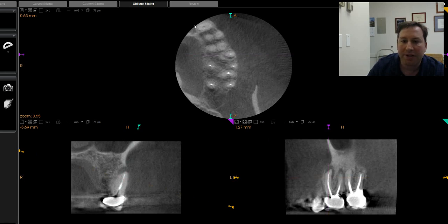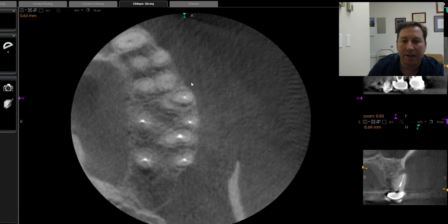And here we can actually see, I'm just going to focus in on the axial section. When we look at this tooth, this mesiobuccal root, we can see it's an oval shape, and we see here that the root canal fill is deviated slightly from the center. The law of centrality dictates that any nerve and blood vessel that is responsible for the development of the tooth really has to be centered within the root.